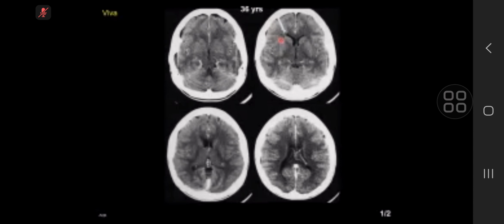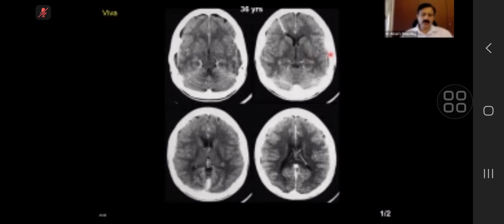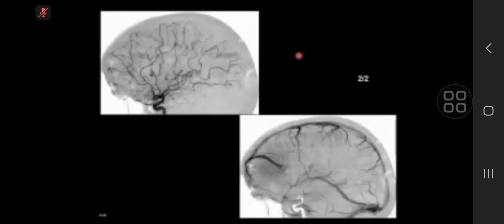This is enhancing uniformly, and I can't see it on the lower slices, so it's above, just at the level of the lateral ventricles in the right frontal region, but it's quite well defined, and I'm trying to think what anatomic location it's conforming to. It's a very straight line type of structure. Yes, I'm just thinking whether it's.